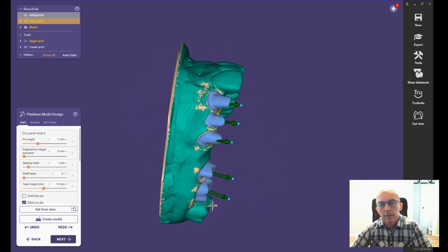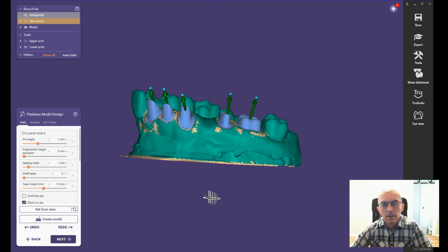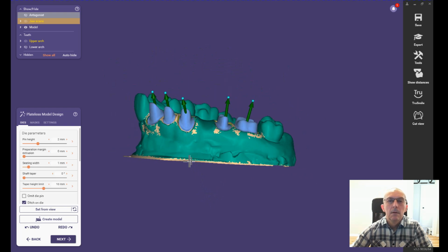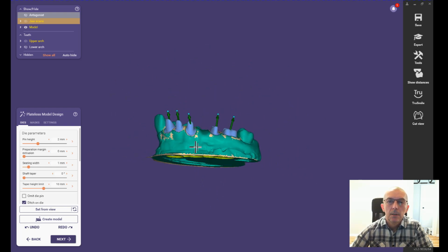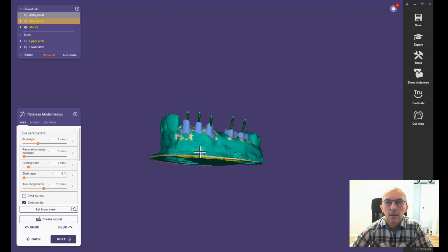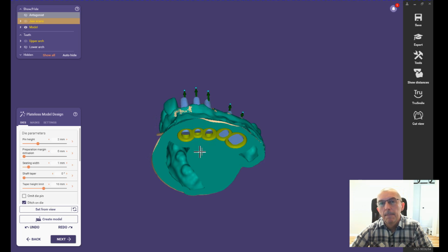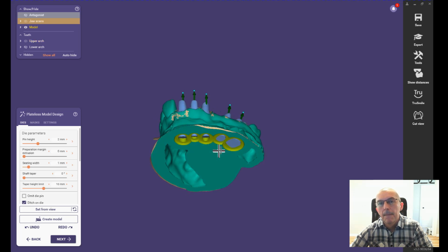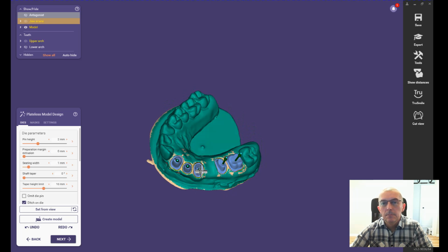Now here, we're going to maybe bring them a little bit more this way.